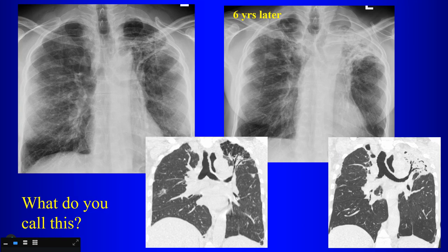So when you come across a case like this, your first thought might be what? Tuberculosis. Yeah, absolutely. So your first thought here would be tuberculosis. But we're talking about fungal infections. So is there a particular fungal infection that might do this? Not allergic pulmonary aspergillosis, no. But since you touched on aspergillosis, what is this if this is aspergillosis? It can look like TB.